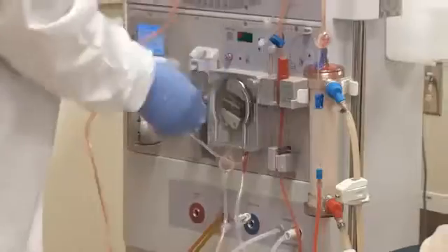Dialysis staff must perform routine disinfection of the dialysis station to prevent the spread of infections. The following steps are intended to be used when there is no visible blood on surfaces at the dialysis station. When blood or other soil is visible, surfaces must be cleaned prior to disinfection. Here are the actions you should take before beginning routine disinfection of the dialysis station.